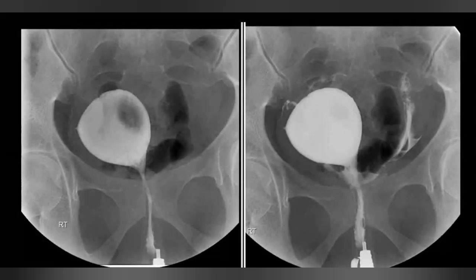So we see the endometrial cavity is enlarged, globular, abnormal shaped, and on subsequent examination, we see there is free spillage of contrast from both sides. The tubes look patent. So this appearance of the endometrial cavity is due to presence of a fibroid. Fibroid may cause enlargement of the endometrial cavity.